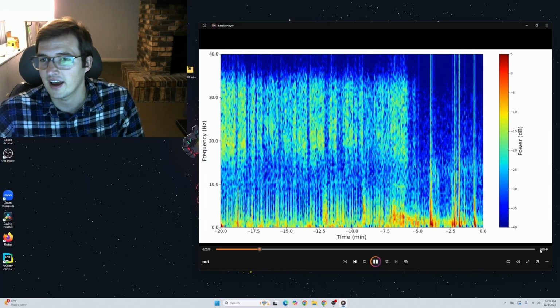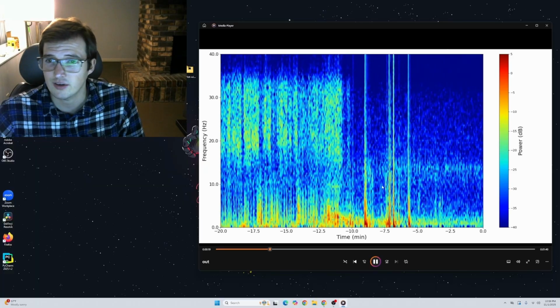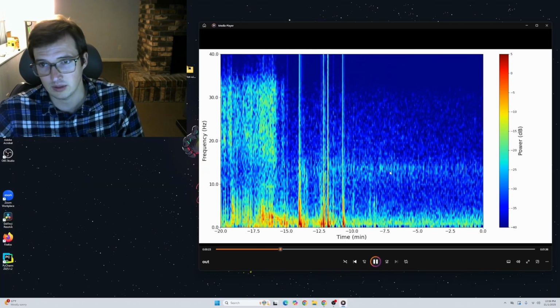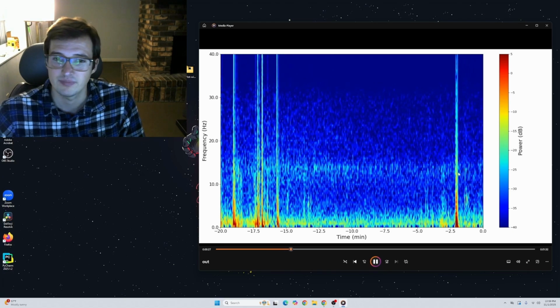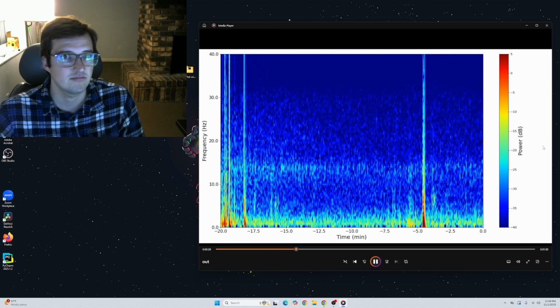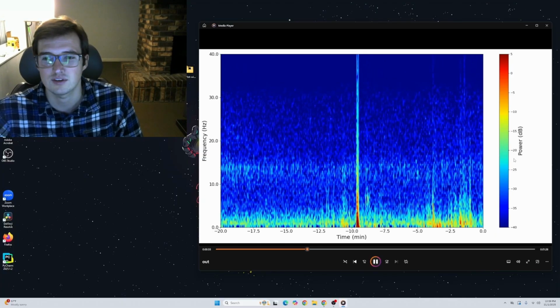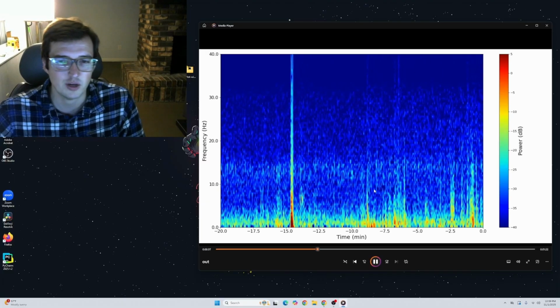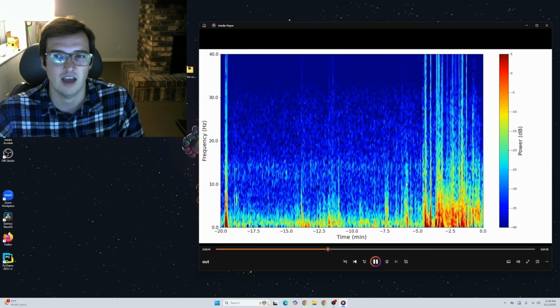This EDF file had quite a lot of data. So yeah, looks like they were sedated right here, and there's something like propofol probably indicated by this line in the alpha beta region. And there you go. That is our data. That's how you get data off of these Masimo SedLine displays. And that's also how you can use SedPlot to quickly view some of the data if you just want to get your hands on it and make animations like this.